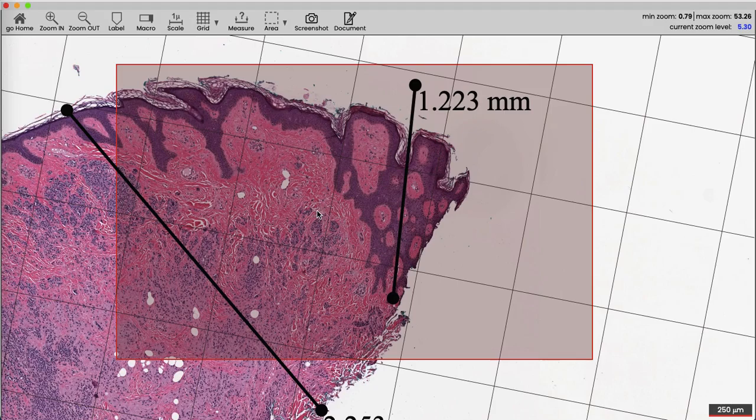This is made, of course, if you want to highlight an area of your image, but it's also linked to our artificial intelligence model, which is a plugin where you will just define an area and send this area to post-processing toward a server for specific features.